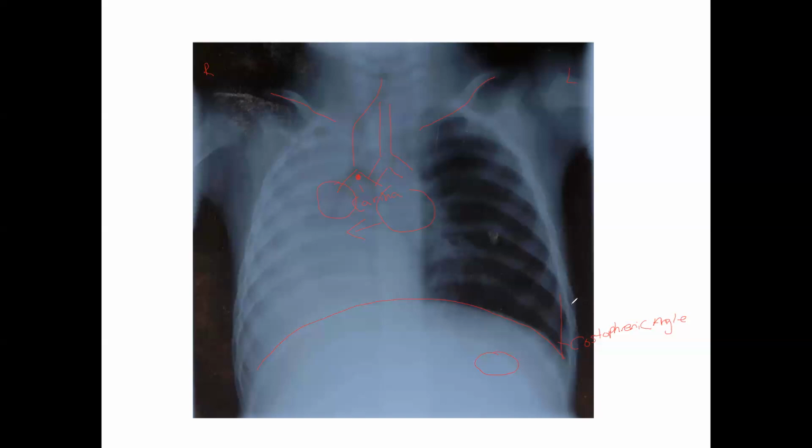So when we're looking at overall quality of films, the posterior anterior film, or the PA film, is actually the film of choice. But with that in mind, not everyone in the hospital can go down to the radiology department and have that done.